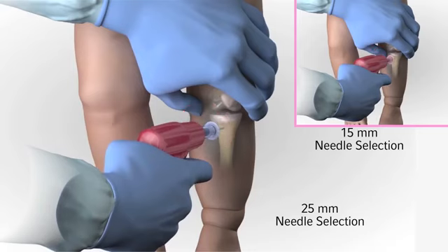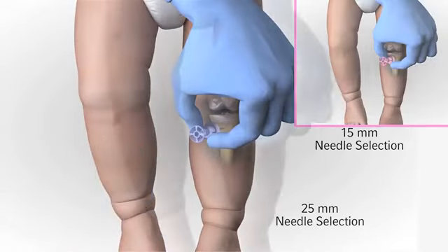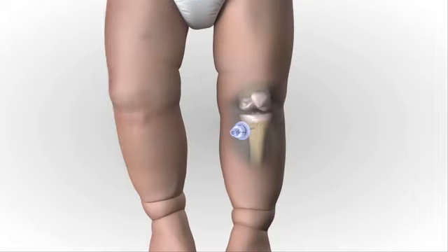Gently drill. Immediately release the trigger when you feel the pop or give as the needle set enters the medullary space. Avoid recoil. Do not pull back on the driver when releasing the trigger. Hold the hub in place and pull the driver straight off. Continue to hold the hub while twisting the stylet off the hub with counterclockwise rotations. The catheter should feel firmly seated in the bone. Place the stylet in a sharps container.